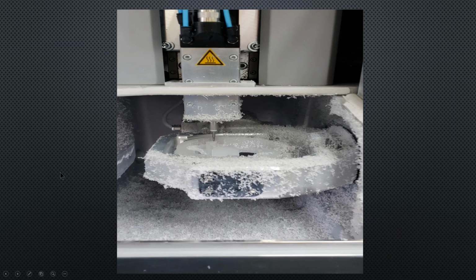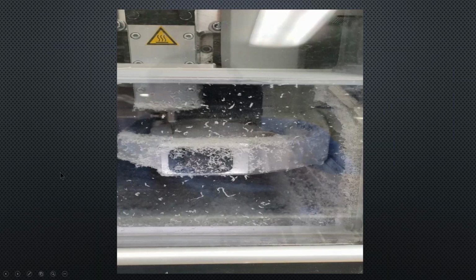I don't know that you'll have a problem, but you just want to be aware that it's a little bit more chunky. And I've dealt with a lot of labs that have been milling it and have had zero issues. So that one place that I was actually physically at, like I said, I think it was just the combination of issues with the way their mill was set up that caused the problem. And I wanted to show this.